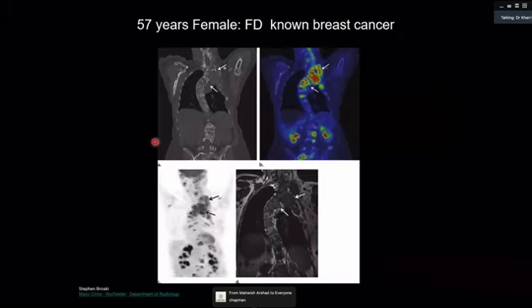And this is again from literature from Mayo Clinic. This patient is interesting, where this is a PET scan, by the way, where the patient has a known breast cancer, and they were worried about what's happening in the spine, and ultimately it showed uptake on PET. And ultimately it proved to be fibrous dysplasia. Point I'm making is that nuclear scans, maybe PET, maybe SPECT, maybe normal bone scan, they do come for polyostotic fibrous dysplasia, and keep your minds open for that.